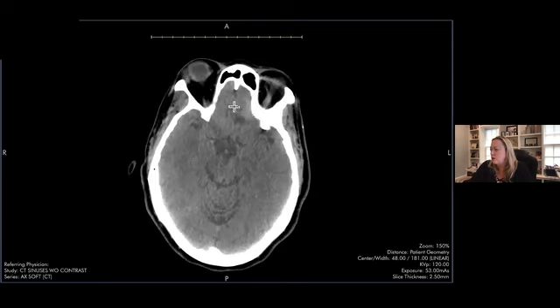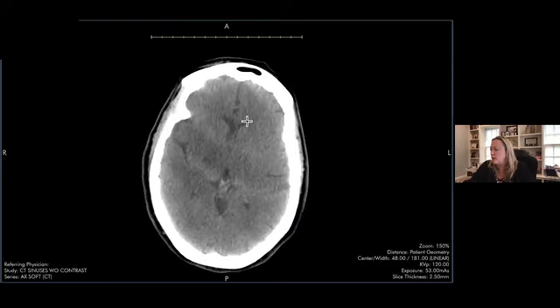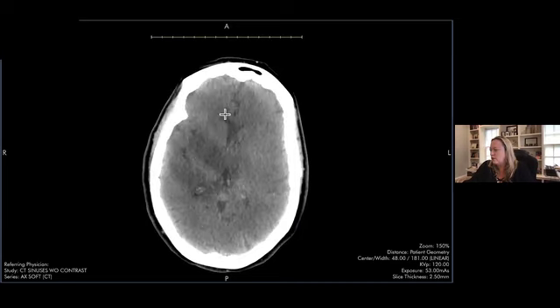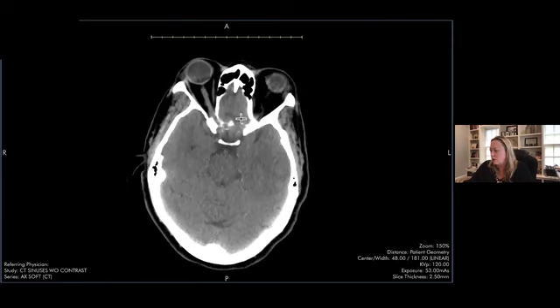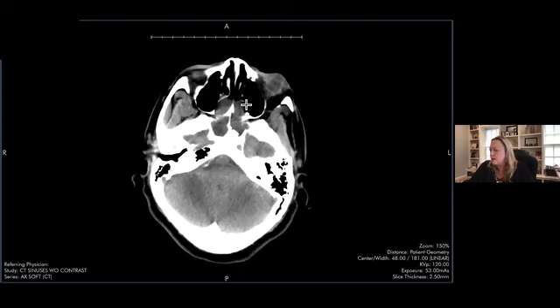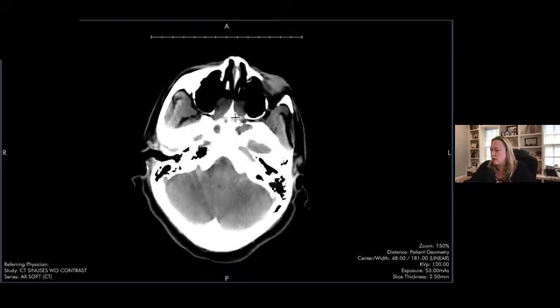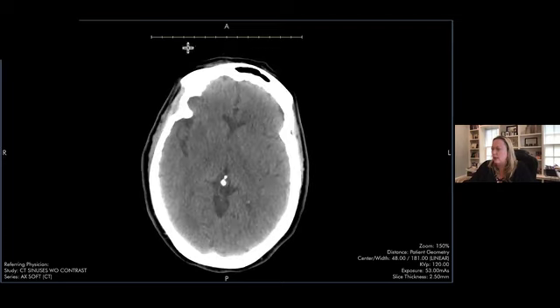And then when you come up to your brain, there's some low attenuation involving, coming all the way up to the inferior aspect of the left lateral ventricle, a little bit of asymmetry in the lateral ventricles. So this hypoattenuation may be encephalomalacia, not sure, coming all the way down to this abnormality. And then because we saw soft tissue that wasn't just run-of-the-mill low density polyps, and we're questioning this soft tissue abnormality in the brain, an MRI was recommended.